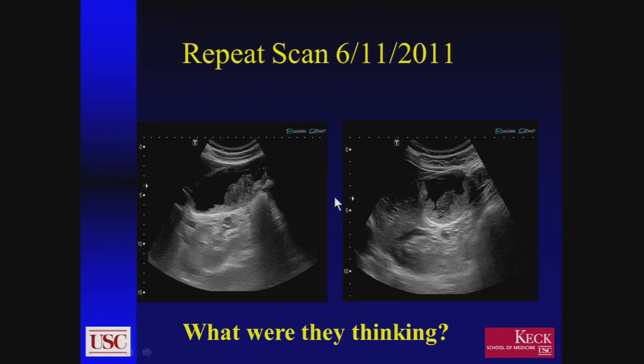Obviously, to me, sludge should layer. Sometimes it's very slow to move from one part of the gallbladder to the other, but particularly in a patient with a history of melanoma, which is known to sometimes go to the gallbladder, when you start to see a lot more material within the gallbladder, you really need to start thinking of something bad. Now, theoretically, melanoma may go to the wall, so the other question in somebody like this is this nodular mass that's growing within the gallbladder now over 4 years.